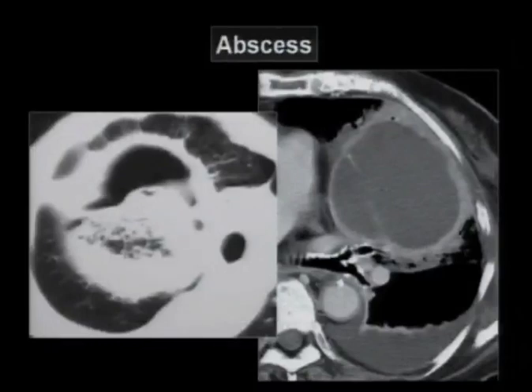This is a pulmonary abscess, 2 cases here. The case on your left is actually frank pulmonary gangrene, which may happen once in a while with a really aggressive abscess. This patient actually infarcted their large abscess, and this is a chunk of lung that should normally be tacked up right around here or so. And it just fell away as the infection more or less infarcted all the blood vessels feeding this abscess cavity, and the lung just fell away. This is what's been referred to occasionally in the literature as the iceberg sign, this hunk of lung kind of floating on the rest of this stuff in the abscess cavity.